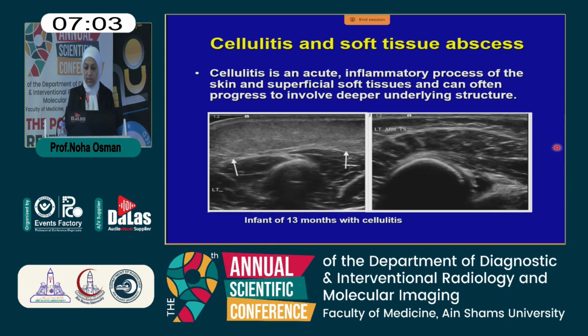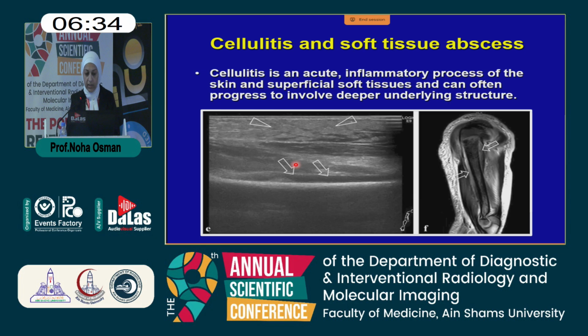Regarding cellulitis and soft tissue abscess, cellulitis is an acute inflammatory process of the skin and the subcutaneous tissue, and can often progress to involve underlying deeper structures. Of course, cellulitis is a clinical diagnosis. However, we may need ultrasound to detect any underlying superficial pathology. In this case, compared to normal skin, there is increased thickness and echogenicity of the skin and subcutaneous tissue, referring to edema of cellulitis.